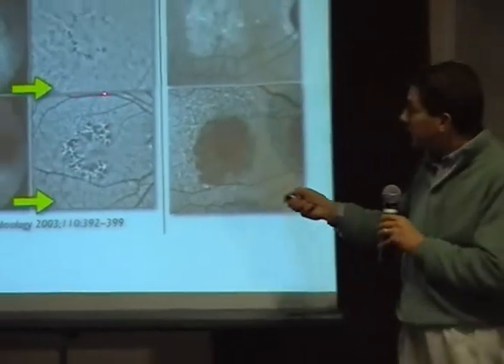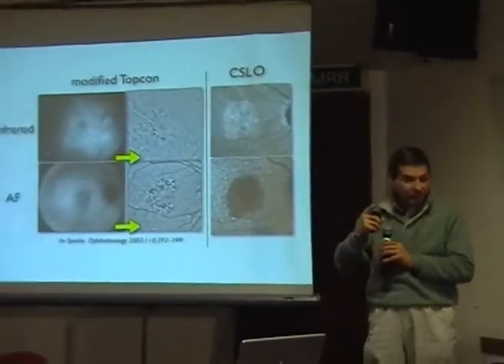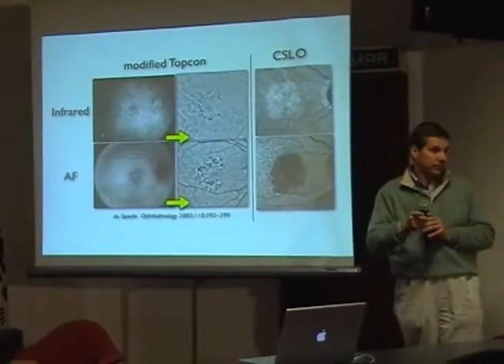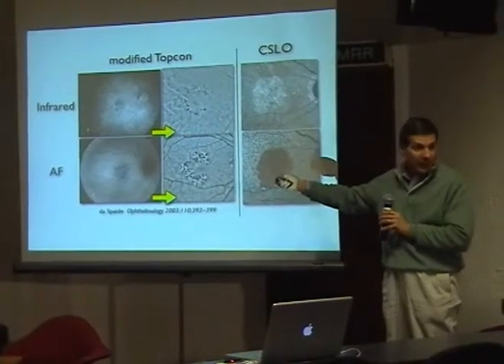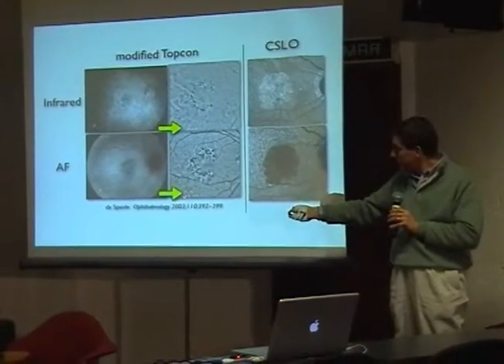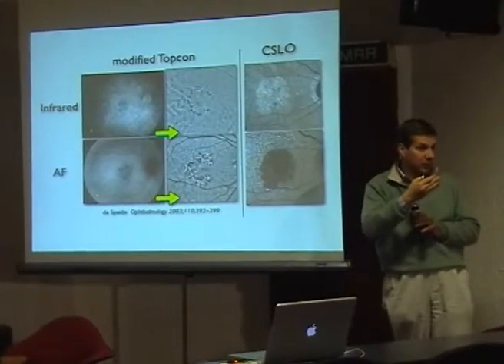It means that you take some image that comes from the reflecting lights and not only from the fluorescent light. Was I clear enough? So it's impossible to see some choroidal vessel if there is no leakage. Because here we have some reflective light from infrared that comes and interferes with the fluorescent image.